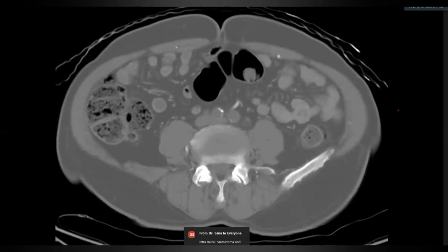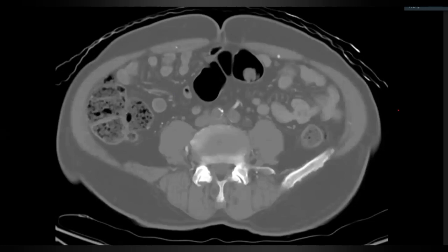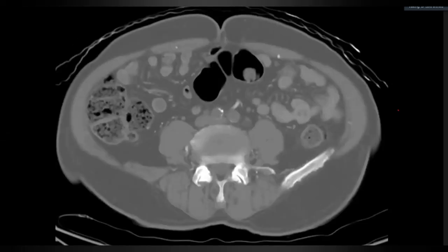Sir, this is an aortic aneurysm. Okay, just focus on the aorta. So as we go down, what's happened to the aorta? What happened to the vessels? Where are they? So there is no opacification of the aorta with the contrast, and the vessels are also not opacified. Okay.